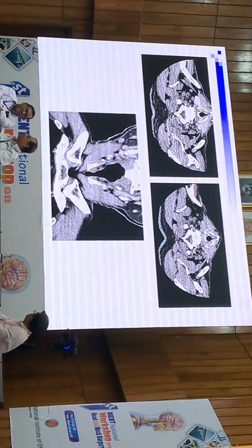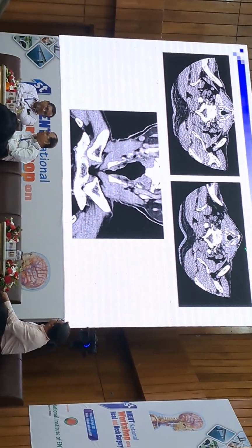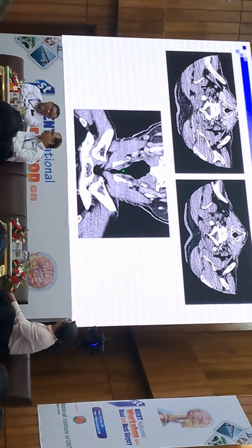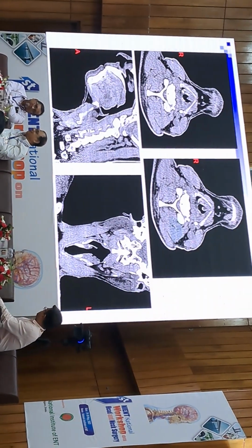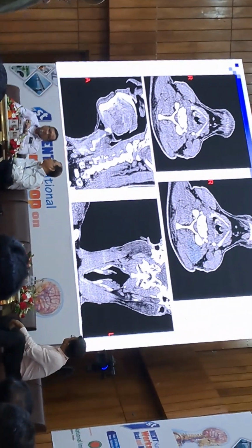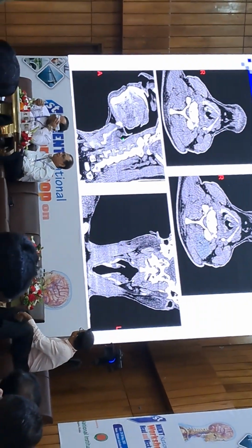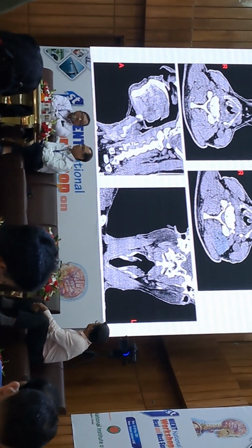Here is a T1 tumor, the small tumor I showed you previously, a small lesion in the glottic area. It is a T1 tumor. Another tumor involves both sides of the supraglottic area. Okay, this is a T2 tumor.